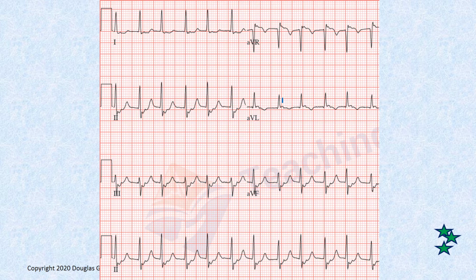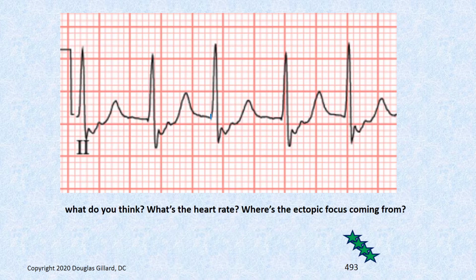What do you think? Something funky going on there after the QRS complex. Yep, let's blow that up and take a look at it. What's the heart rate, too, while we're here? Well, let's just grab this one. That would be 300. That would be 150. This one's pretty high. This is over 120, 125. This is probably 130-ish, and 130 somewhere.